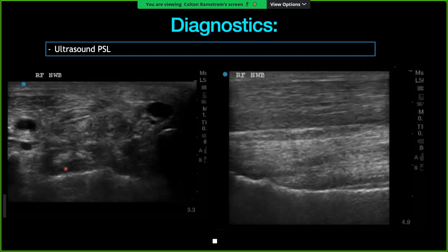Then I included this image in here as well. So again, this is a non-weight bearing proximal suspensory view. Same things that we were talking about on this lateral branch here. Then again, non-weight bearing, so we're going to have some artifact, but I did think that this part of the check ligament or the accessory ligament of the deep digital flexor tendon was a little bit irregular as well.